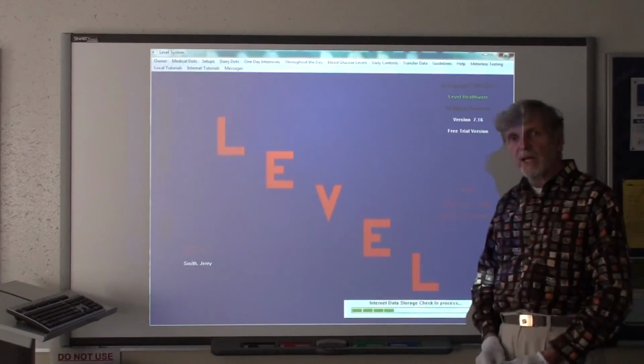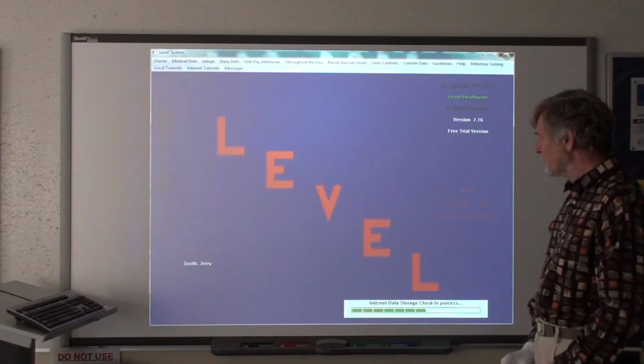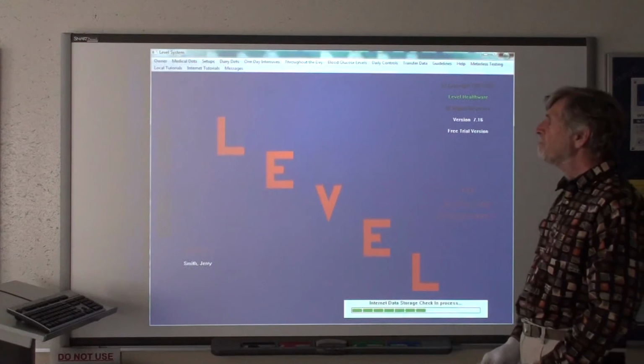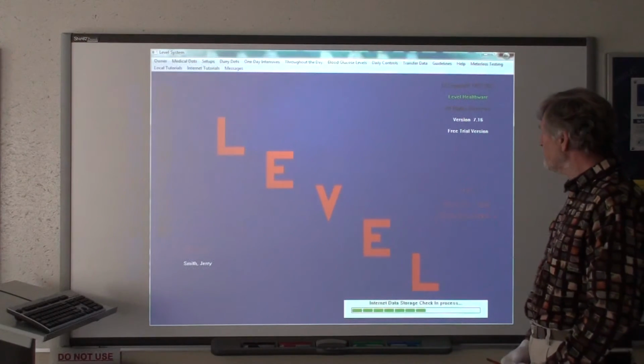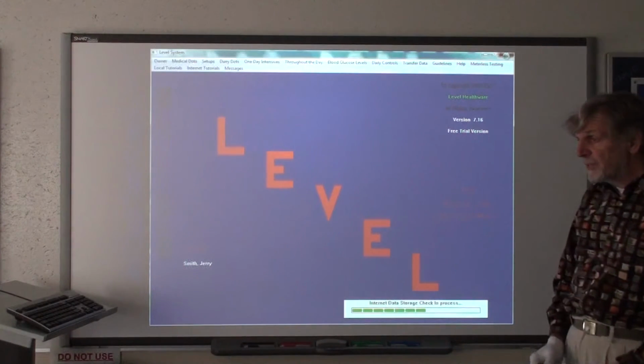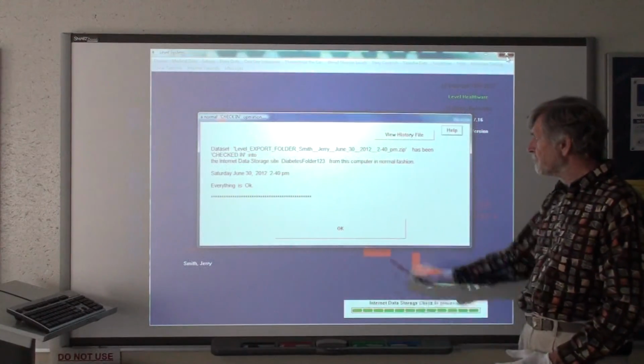So checking back now into internet data storage, in case that we had some activity there, it would then be present to the patient on the next checkout themselves. These checkout times tend to take anywhere between 10 to 90 seconds, depending on the speed of your internet connection.